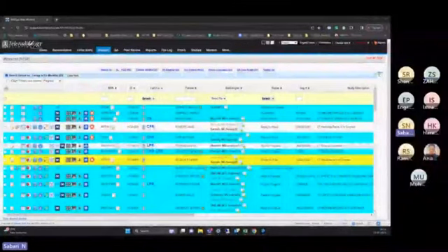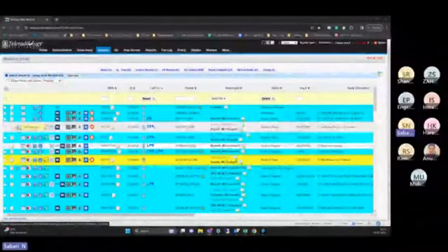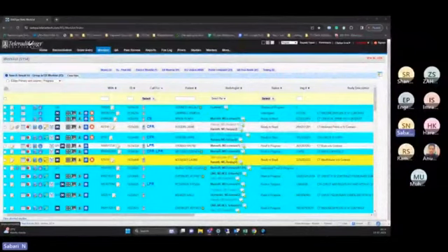So suppose the patient went to a different hospital, had the scan done, and then moved to another hospital. When he comes to the new hospital, he can share his previous reports and scans from that hospital. The technician or the front desk user can even scan and attach the report and the images. See here, the attachment is showing for this patient.